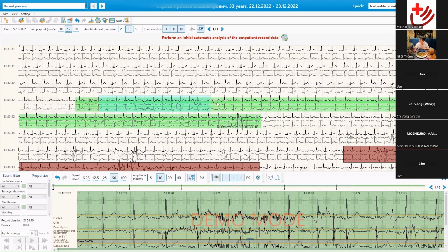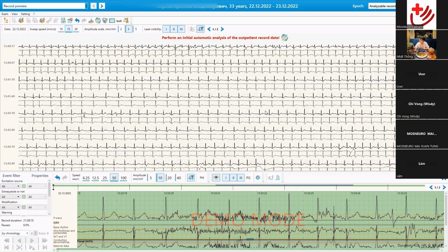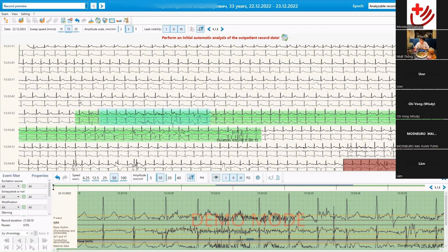So I can do something with this part of the recording. But this simple way of selection is not convenient when you want to select big chunks of data, again, for maybe noise reduction or for other purposes. In this case, you should use another trick, and I will show you. You again press the Shift button and click the left mouse once. Do you see this marking appear on the screen?